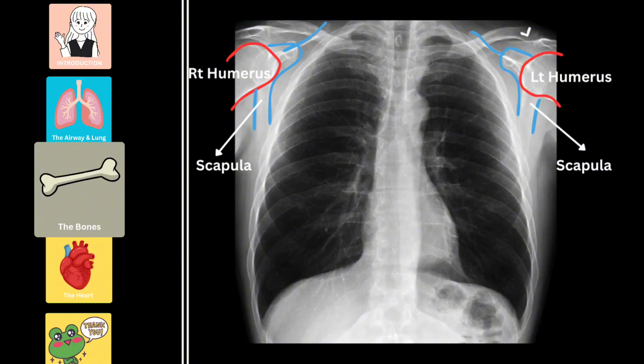Notice that you don't see the scapula overlapping your lung fields. That's because properly obtained plain films should have your scapula out of the lung field views so that your lungs are unobstructed by layers of bone and soft tissue.